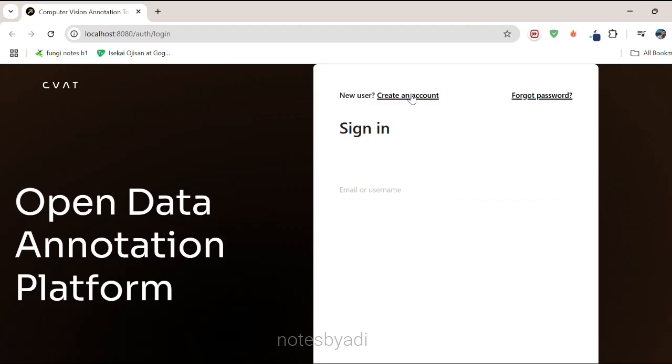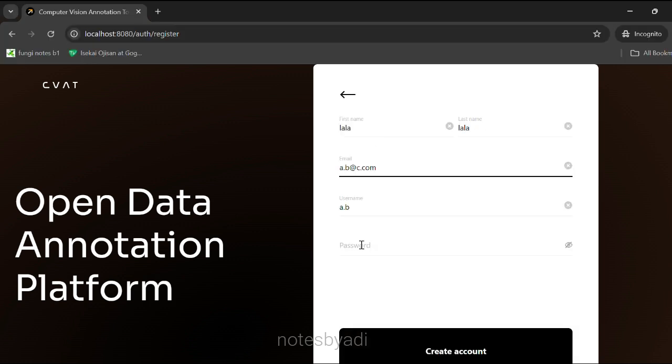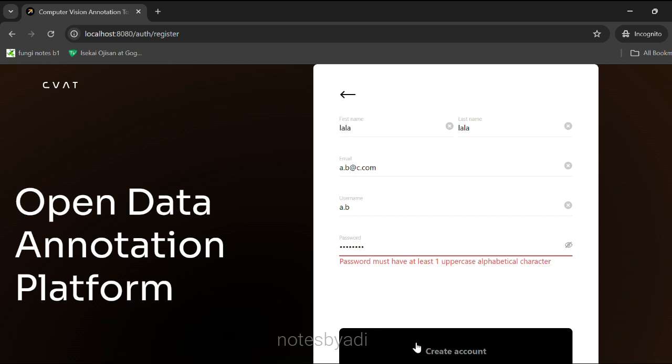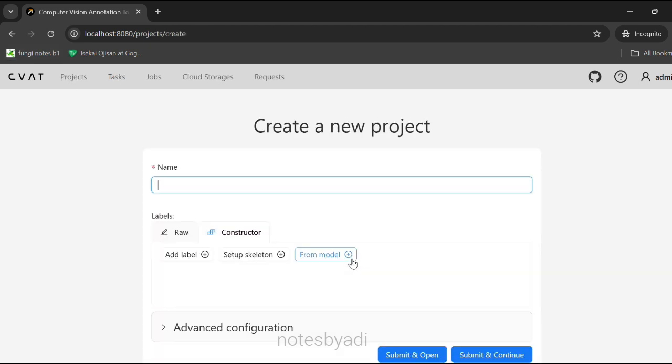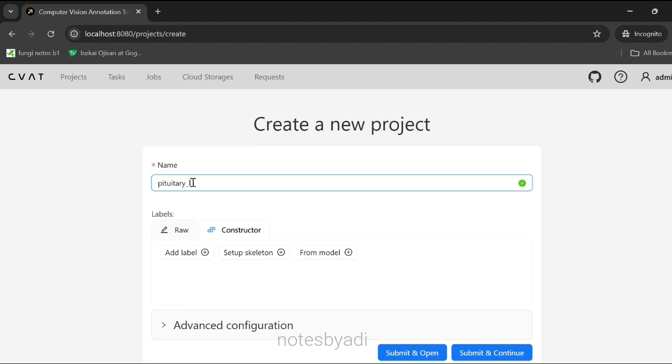You could also skip this step and do the creation of the admin account on the application page, as I also do here. This gives you the access rights to the project so that you can even delegate lower level users who can be assigned smaller annotation tasks later. Since my project only has 3 images, I will go ahead with the admin user and import the zipped images folder into my project.